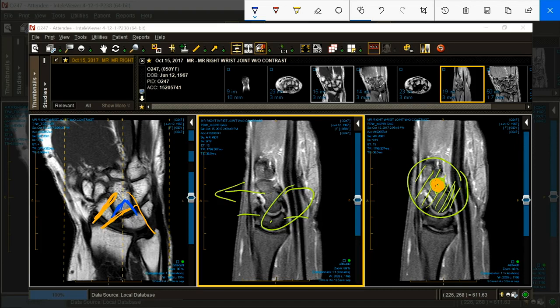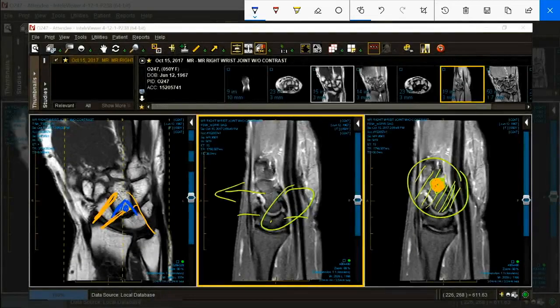The only reason that's important is in this location right here. There is a weakness of the capsule that is non-ligamentous supported. So in certain complex instabilities, the capitate is going to come down and anterior, forward. When it does that, it encroaches on palmar structures. This is called the space of Poirier.